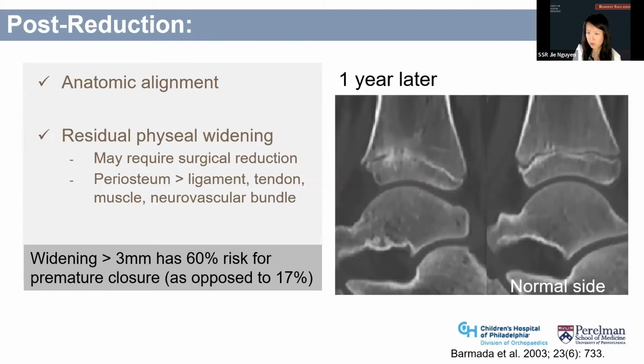This is the same patient 1 year later, and we have both sides in the bore. So we took some images from the other side as well. You can see that there is a bar right in here, and then there's asymmetric appearance of the epiphysis. And that's because the height where the growth plate is different is because there's differential growth. Even though anteriorly where we see the most widening, it's not closed, it's sick. So it's not growing as much, and therefore it's not pushing the metaphysis out as far as the posterior where it's not disturbed and completely normal.